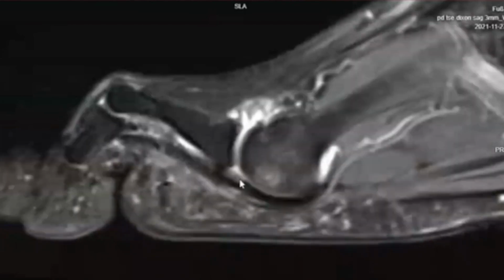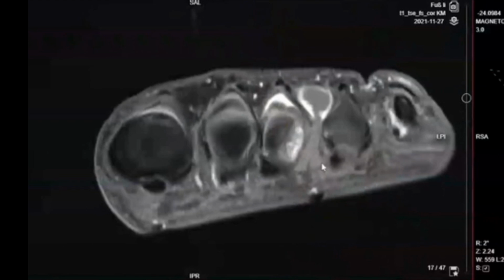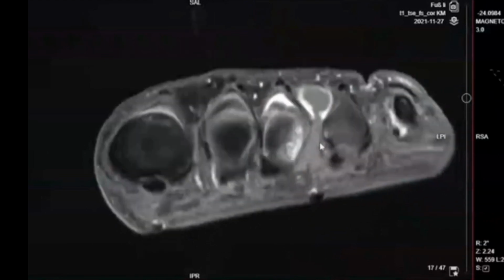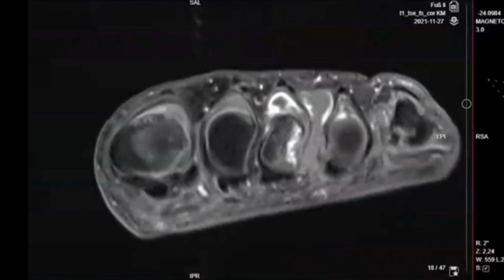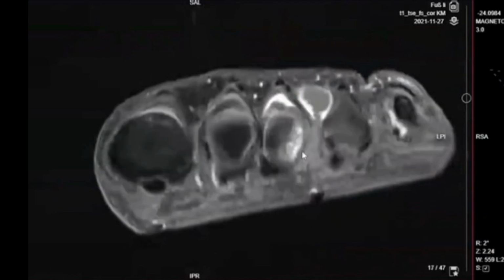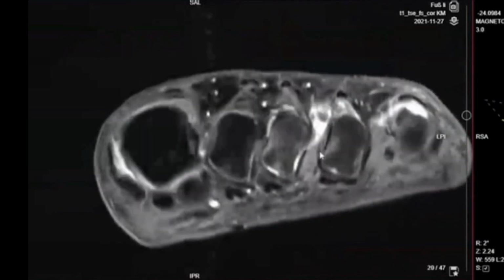Also notice the exaggerated joint effusion and the cartilage loss in this location. So pseudoneuromas and neuromas do have a crossover, especially when they're this large. This one causing certainly a degree of pain and mass effect, exacerbating the erosion and altered biomechanics. I'm certain that the patient probably experiences a click.